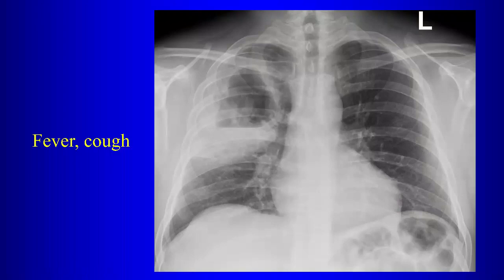Local consolidation of the right middle. Pneumonia. What's that? I guess I could say right middle lobe pneumonia. Well, first of all, what lobe do you suspect it might be? It's kind of high for right middle lobe, right?